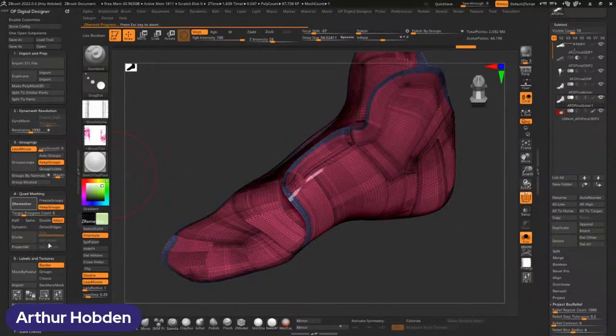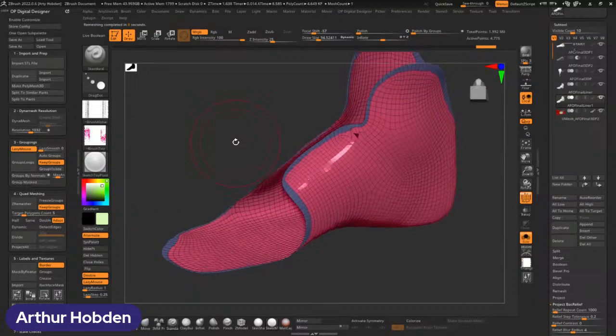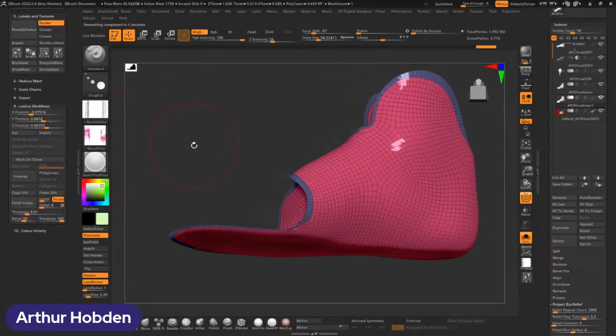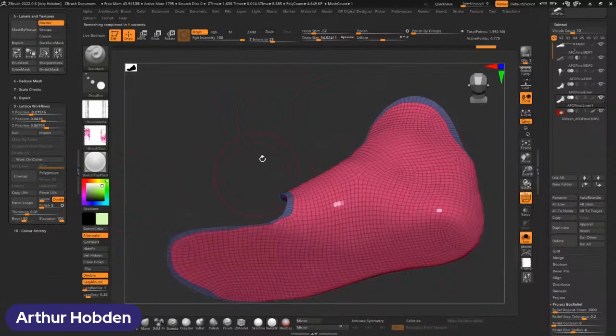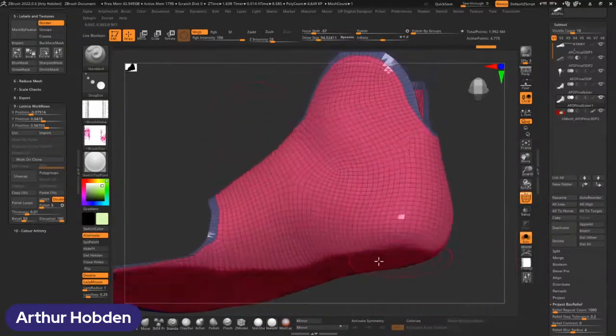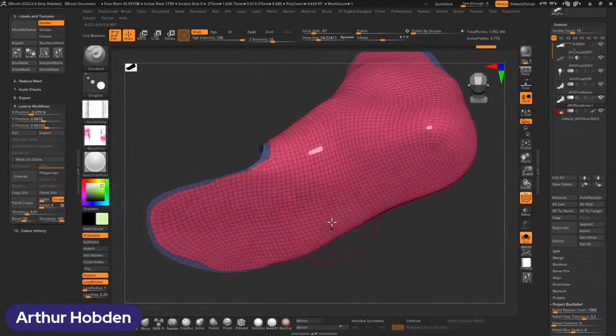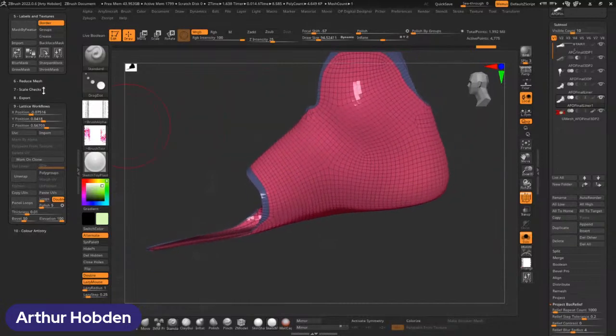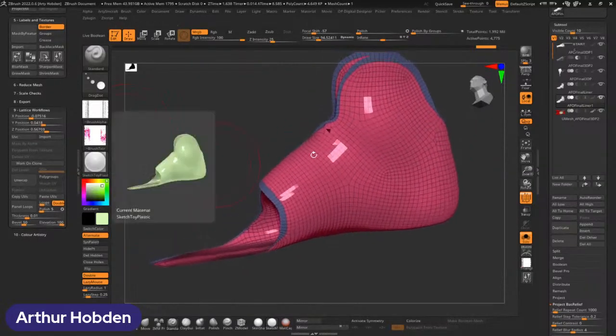And the reason why I'm doing this is because we can take a quad mesh and unwrap it and make it flat and then apply a texture. So we get seamless texturing across this shape, because it would be really hard to project or paint a hexagonal texture across this. For example, this shape is really complex. So if I decide to try and do that, how would I do that?